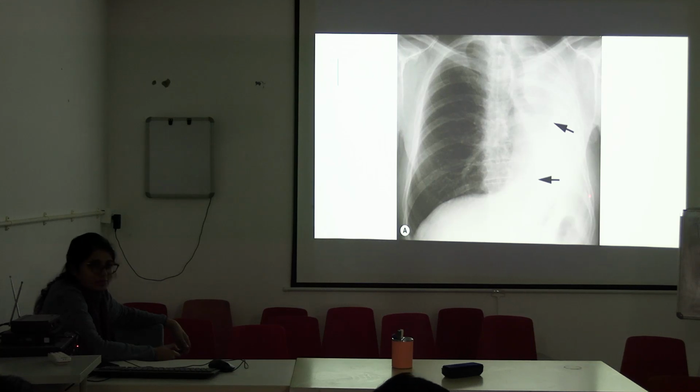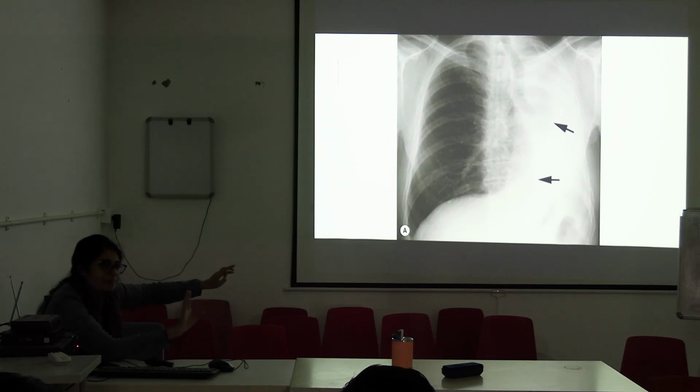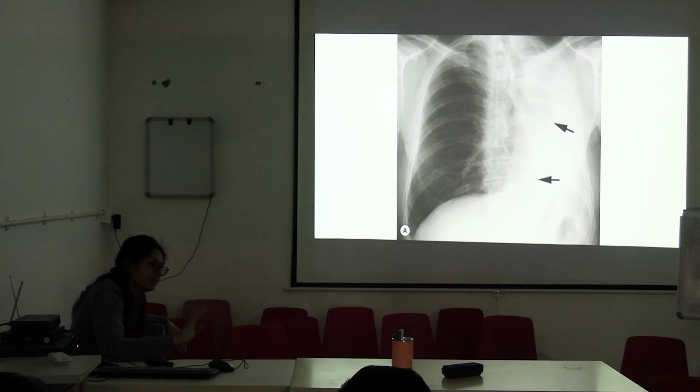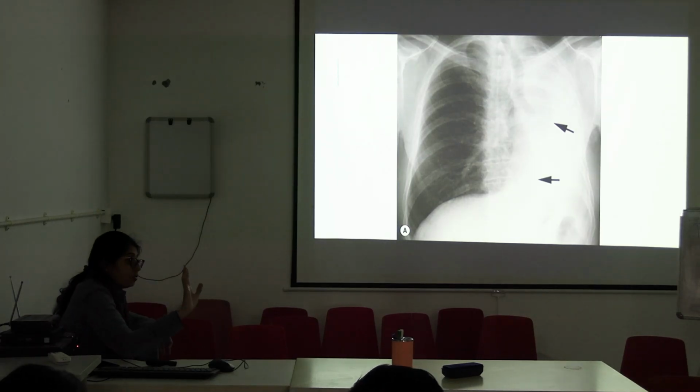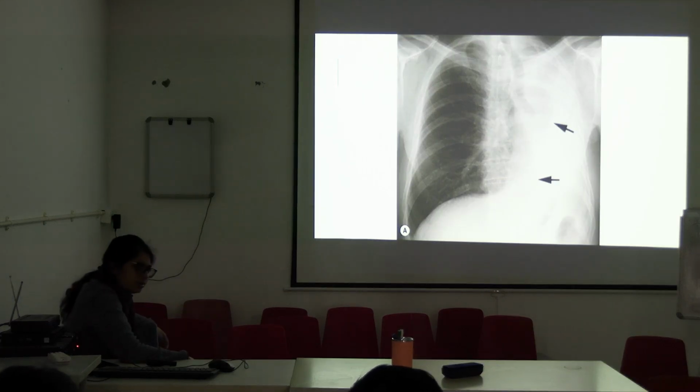A whole hemithorax has collapsed. Describe it, who will do it? You do it. Okay, almost I can agree. Don't look at the trachea. Medial end of clavicle. Okay, then. The left side is not visible, but the right side appears normal. Say what you see. Then, mention collapse first, you will have to describe it. Skin and subcutaneous tissue appear normal. Bones, the ribs appear normal.